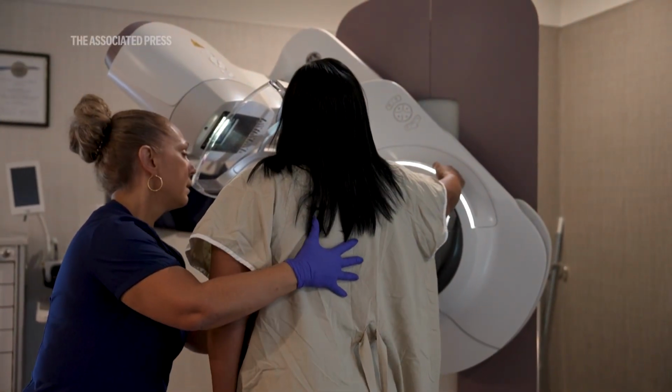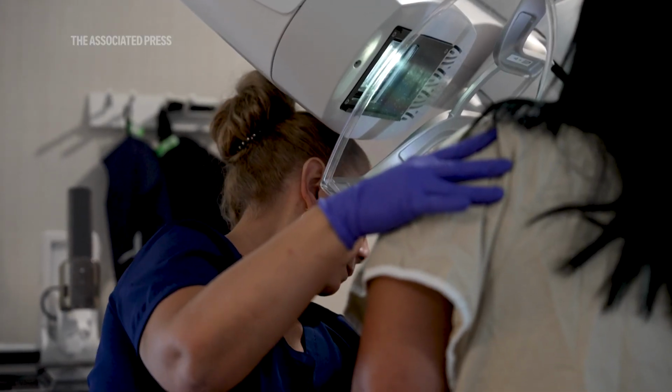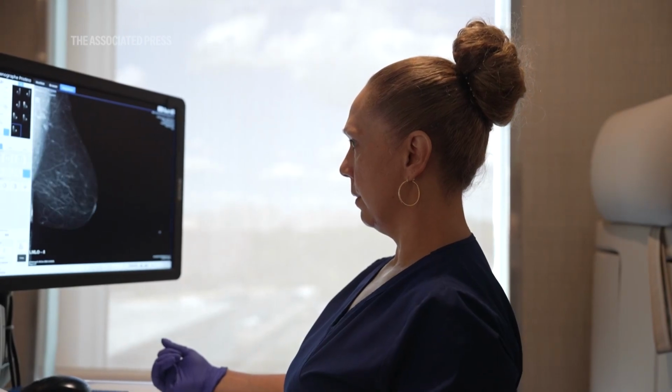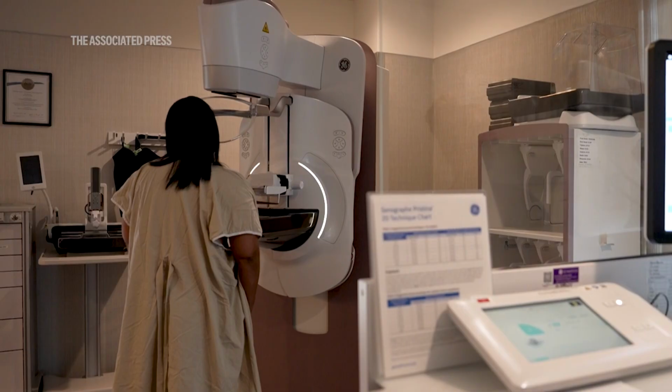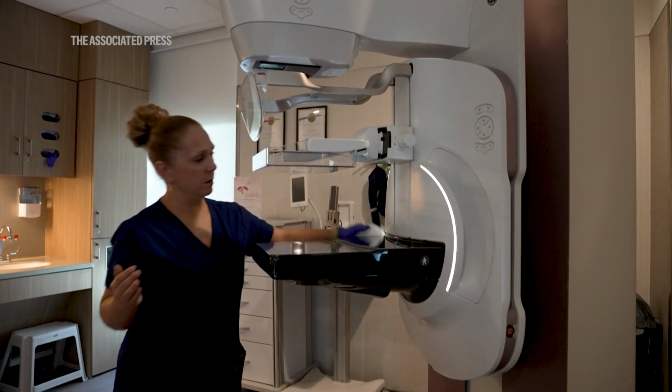Mammogram is the gold standard for detecting breast cancer and for saving lives early. We use that as our foundation when we're imaging women's breasts, and we work off of the mammogram. So even though, like I said, it may hide small masses, other things we look for are microcalcifications, we look for distortion in the pattern. So there are other things that we will see on a mammogram, even in a patient with dense breasts, and that is where you always want to start.